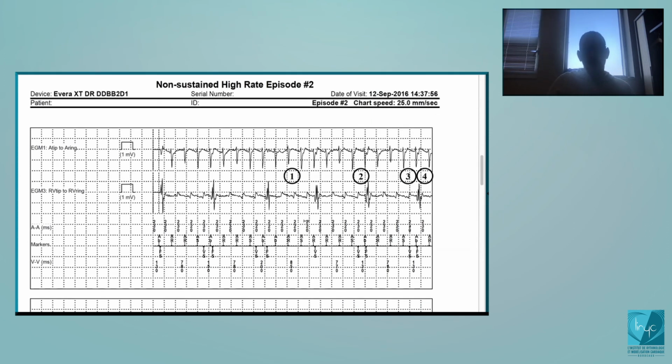So we clearly have an atrial arrhythmia on the atrial channel. Yes. And then you see the prints of the atrial signals inside the ventricular channels. The first ones are not sensed. But what happens here? Yeah, it's sensed in the ventricle. It's oversensing of the atrial signals inside the ventricle. Why is this one sensed and not this one, for example?